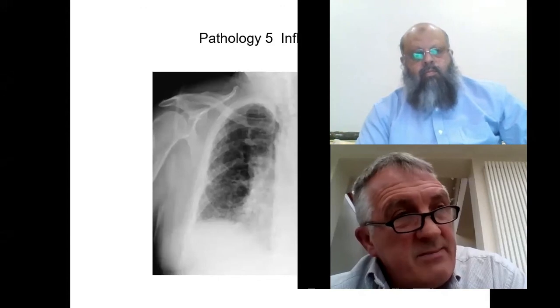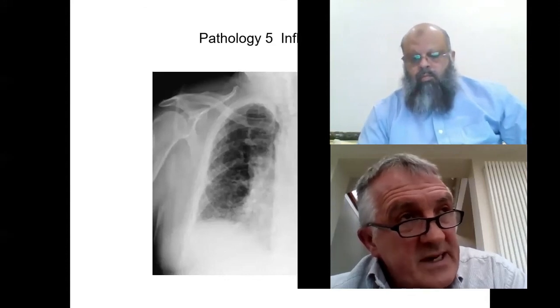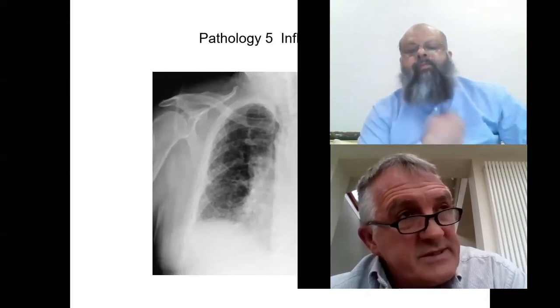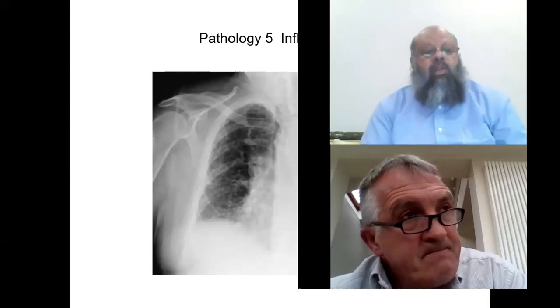Now, if you're looking at a mass, they generally originate from the lung and not from the blood vessel. So you'll see it originating from the lung parenchyma. Malignant processes, particularly in the lung, can invade the blood vessels, compromise them, nip off the pulmonary arteries, and actually provoke thrombosis. But you can definitely tell on imaging, particularly axial imaging, the difference between thrombosis and tumour.